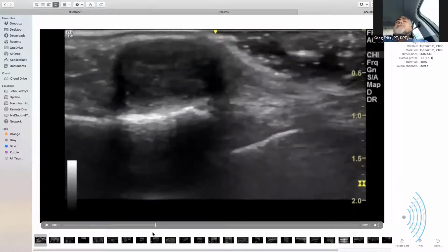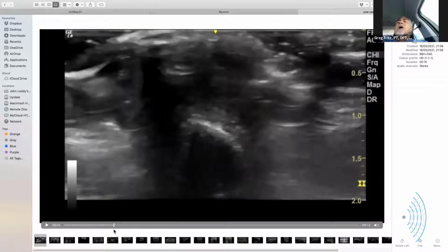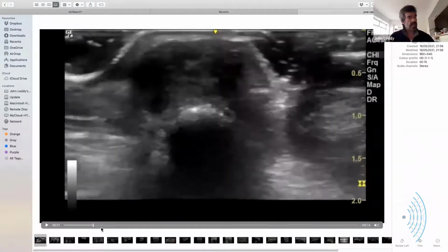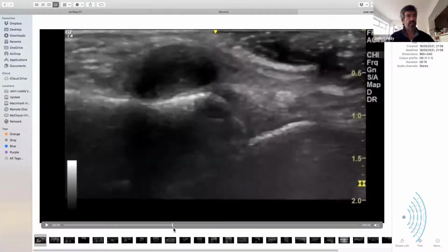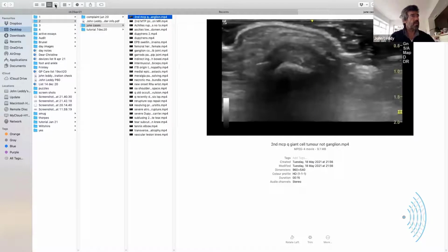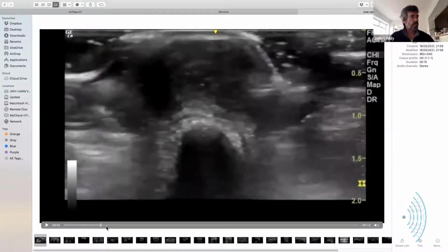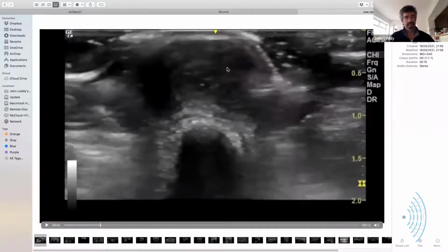What about fibromatosis on the plantar surface, or any kind of ectopic collagen buildup that isn't along the strands? Yep, that's fibromatosis. You see, it looks very similar, just on a grander scale. This is a giant cell, or I think it's likely to be a giant cell tumor. I think this was called a ganglion. Somebody in radiology miscalled that as a ganglion, but I hope you can see that it's got solid content.